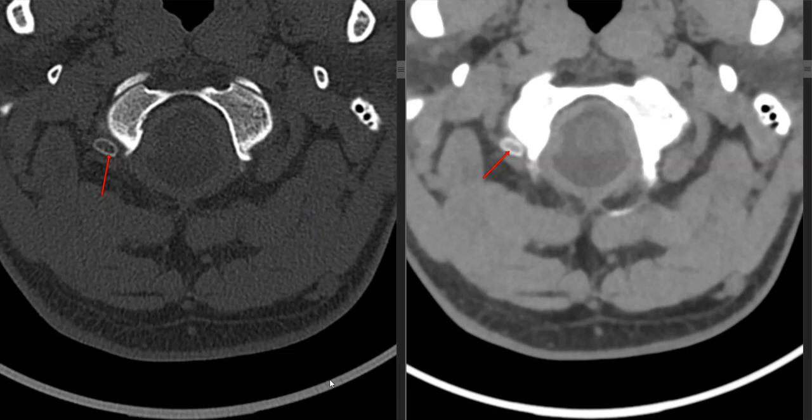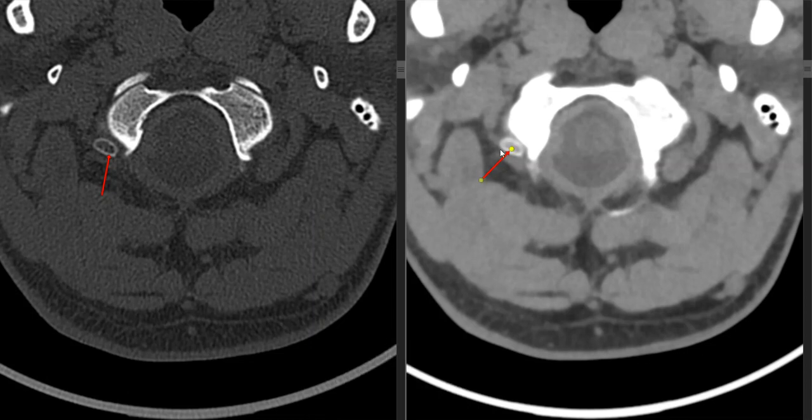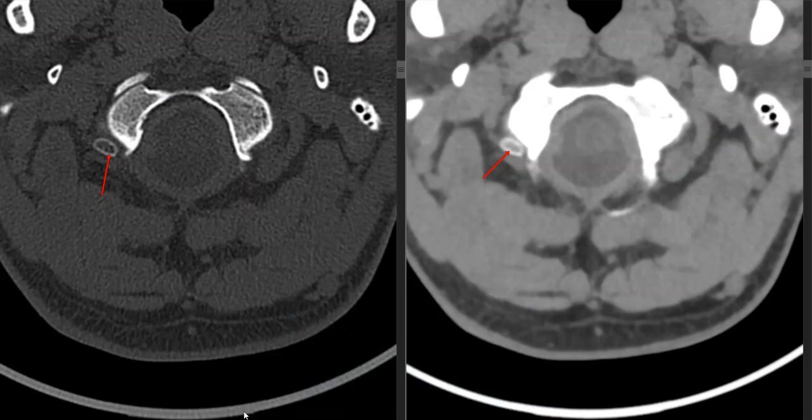Could it be the posterior membrane? I don't know if it's going to go that deep or grow inward, or this is just some other idiopathic thing that's going on. Okay, so I think that's as far as I can go for now at 38 minutes. A lot of information there, and definitely a lot of things that can cause a lot of symptoms.